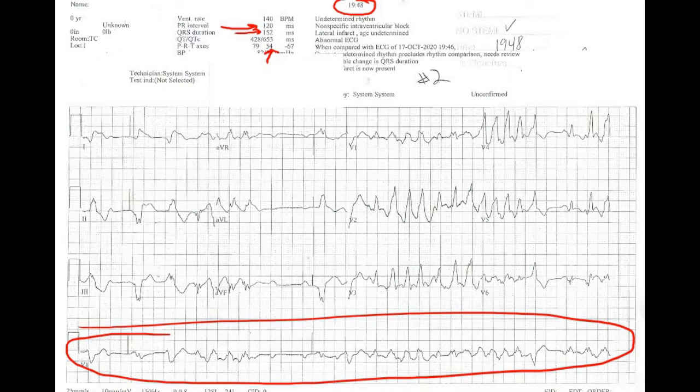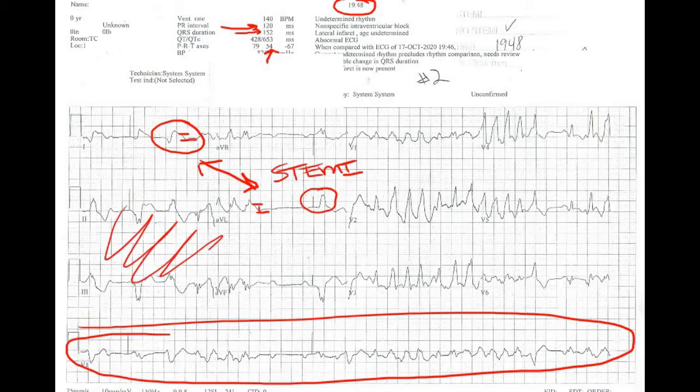And then we have to go lead by lead looking for signs of ischemia. And just like the last one, we have a native beat here with ST elevation. And if I go to the next contiguous lead, this is the cutoff here. This is actually a pacer spike and a paste. So what do we see here? Yeah, that could be ST elevation in this one too. Little less slam dunk here, but we're still in contiguous leads and still able to call this a STEMI based only on that. Still have some junkiness down in these leads, so no joy there.